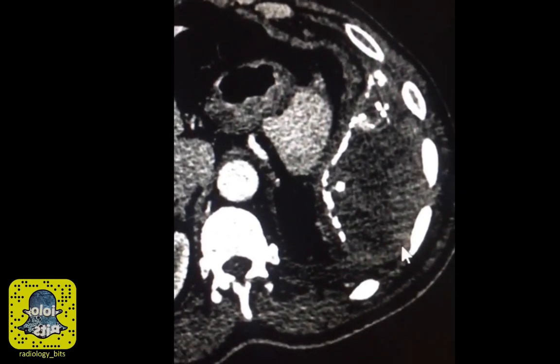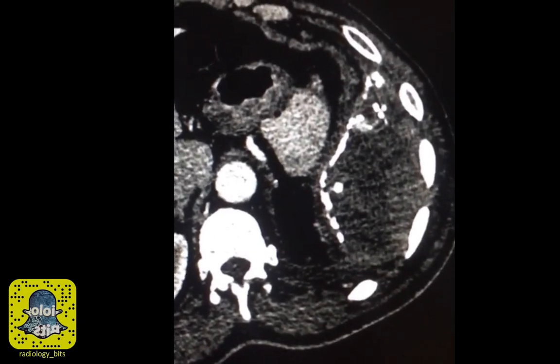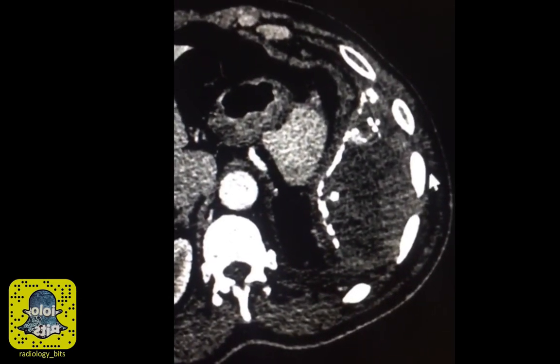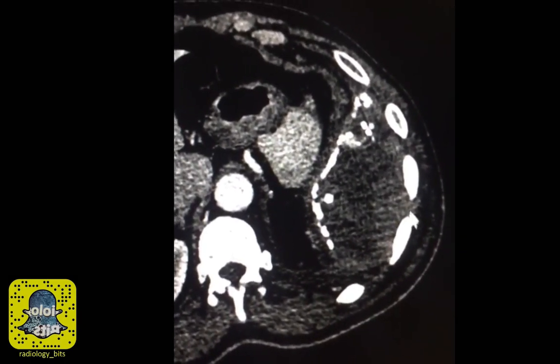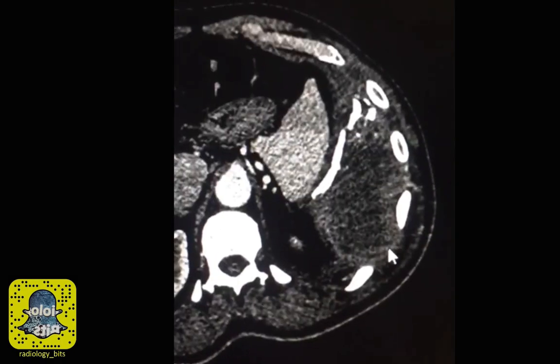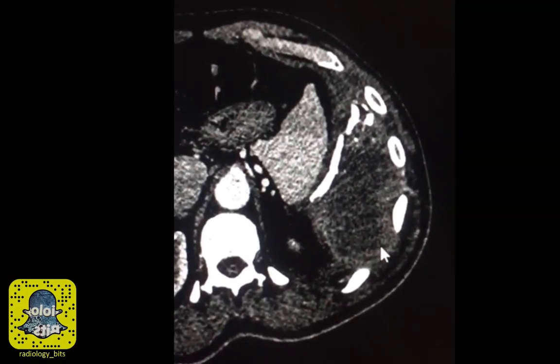We also emphasized the fact that enhancement of the pleura is better seen on a delayed portovenous phase. Yet it's important to look at the pleura very carefully. Any thickening more than 1 centimeter or that invades the chest wall is suggestive of malignancy. And finally, we talked a little bit about this rare yet well-described entity of pyothorax-associated lymphoma.